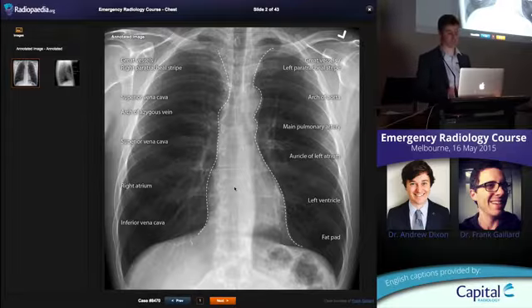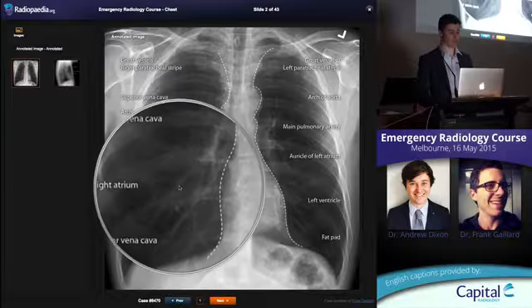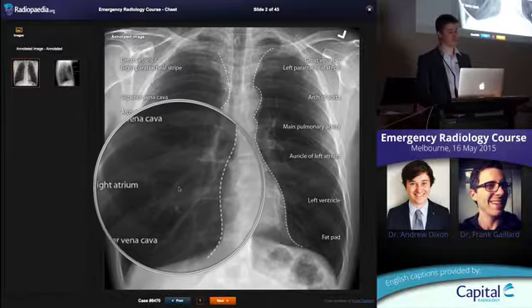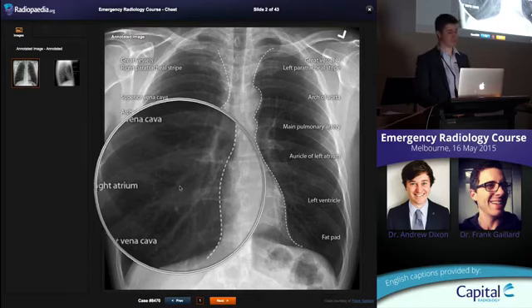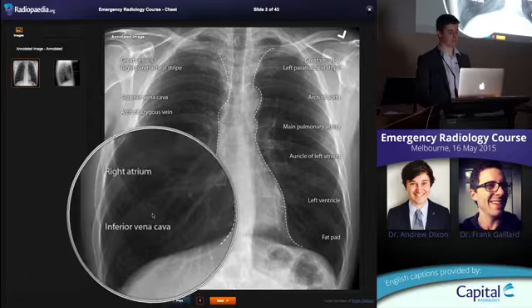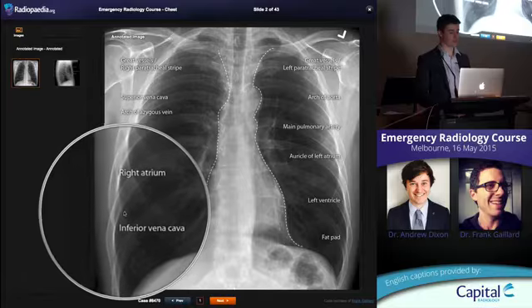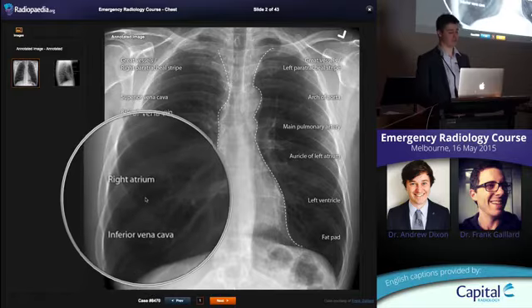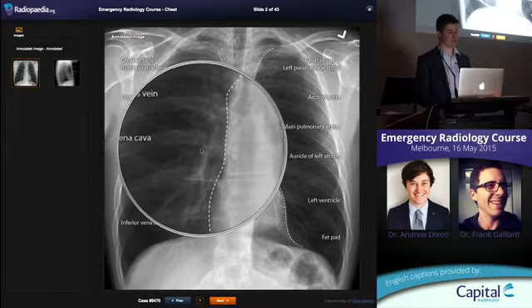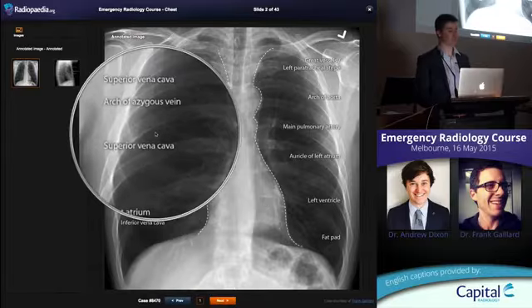But what I'm going to try and teach you now is how to recognise some pathology using X-ray and CT in the chest. I think the mediastinal contours are not really as important as knowing the lungs and what the lungs look like. You've got black air sitting in the lungs, and you've got these nice little white vessels coursing through the lungs, and they go almost all the way out to the periphery. You should be able to trace these in every patient, from the hilum all the way out to the periphery of the lung.